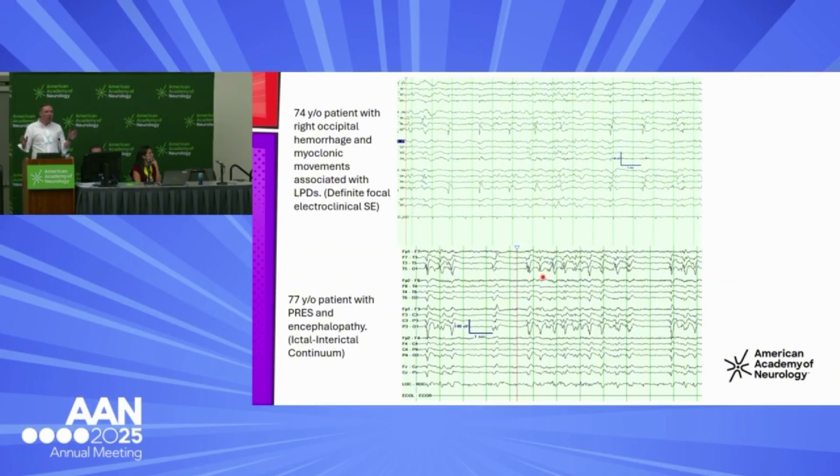One reason we could say is that scalp EEG is very limited. We only see a very little bit of the surface brain. There needs to be a lot of synchronous activity, some people say around 6 centimeters squared, before you see any real change on the scalp EEG. Where is it? Is it in the gyri? Is it in the sulcus? Is it deep? Is it in the insula? Of course, you're going to see things very differently on the scalp. Is it associated with eloquent cortex, like the motoric regions, and that's why you see these positive clinical manifestations?